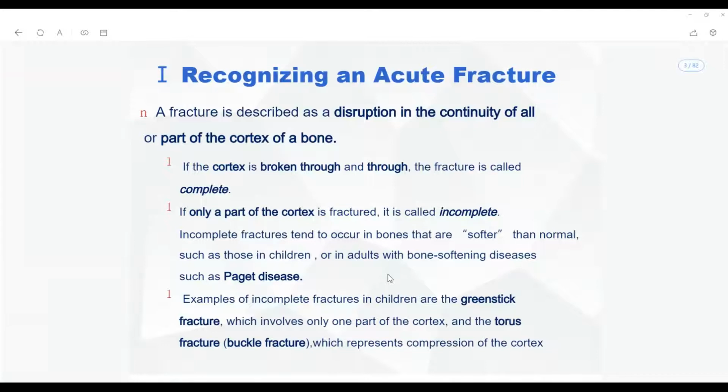So again, it doesn't matter which part of the bone or which bone has a fracture, it looks the same all over. Radiographic features generally do not change, but the anatomical relation changes, and the characteristic of the fracture changes accordingly, depending upon the classification.